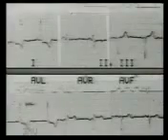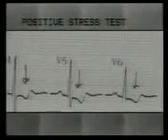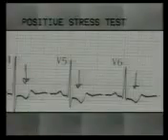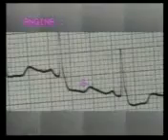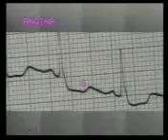Similar changes are seen in lead 1 and aVL also, subendocardial infarct. This is a positive stress test. Note the ischemic T wave inversion and ST segment depression in leads V5 and V6. Another cause of chest pain with T wave inversion is an acute attack of angina. The ST segment is depressed with T wave inversion in lead V5, but this change is transient and will return to normal after the attack subsides.